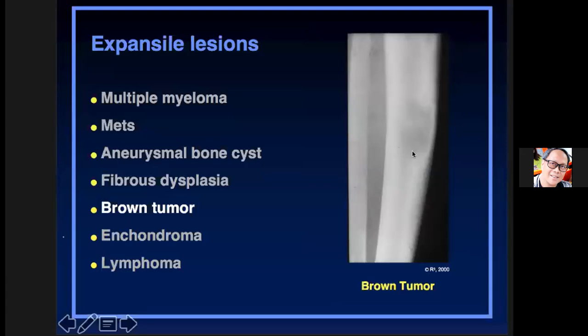What bone do you think this is? Can anyone take a guess? An educated guess? What bone is this? Maybe a long bone. Tibia, doc. Yes, the middle third of the tibial shaft, to be exact, no?